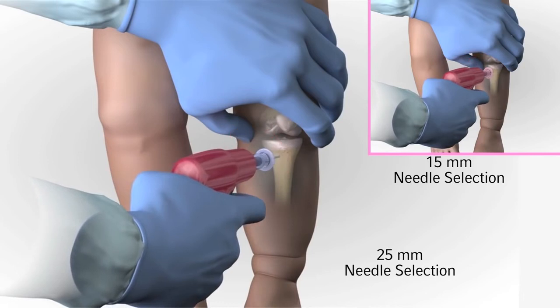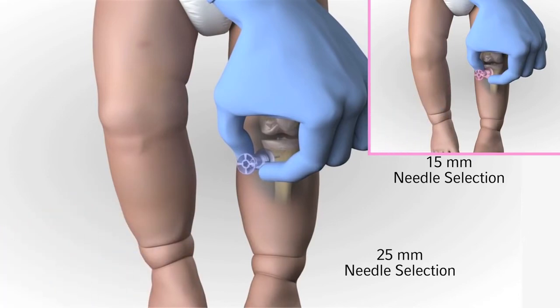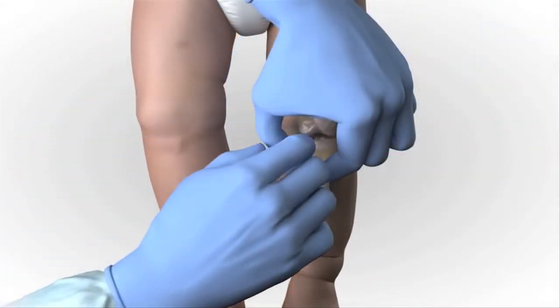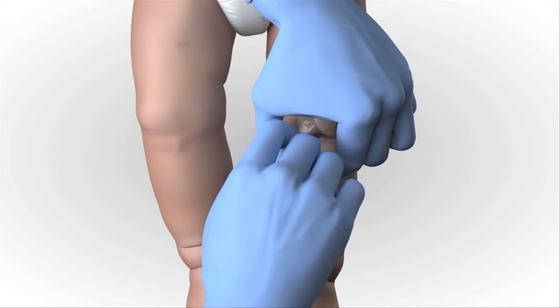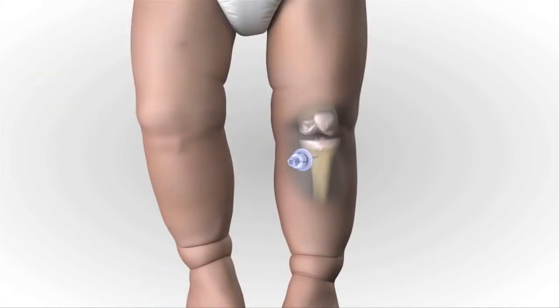Gently drill. Immediately release the trigger when you feel the pop or give as the needle set enters the medullary space. Avoid recoil. Do not pull back on the driver when releasing the trigger. Hold the hub in place and pull the driver straight off. Continue to hold the hub while twisting the stylet off the hub with counterclockwise rotations. The catheter should feel firmly seated in the bone.